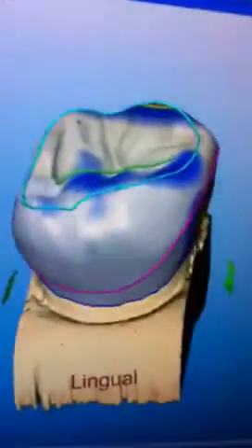Whenever you engage it, it's going to show you, of course, your margin line. Is it hidden somewhere, or does it come up automatically? It's going to automatically come up. Okay. Yeah, there's no way to minimize it or hide it.